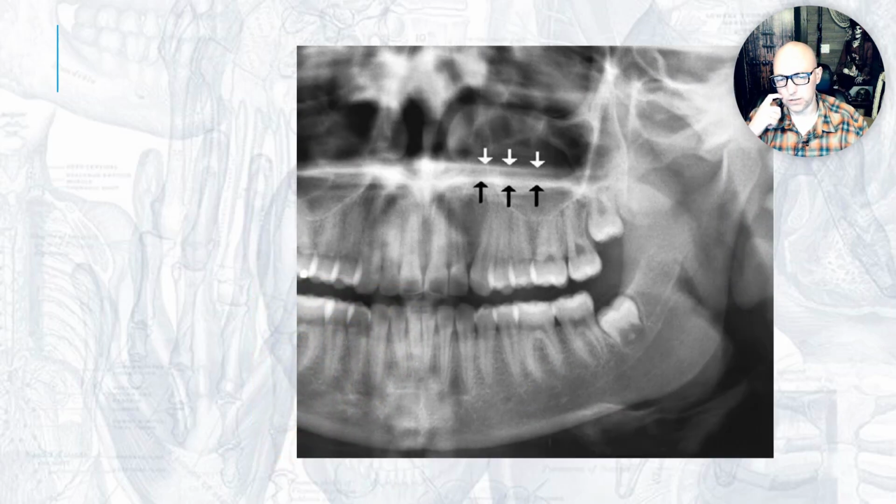All right, what do we have here? What are these horizontal lines? Why are there two of them? Is that normal? Does this patient have some problem? So you'll see this a lot, right? And which one is the real image, the inferior one or the superior one? So this is just the hard palate line.